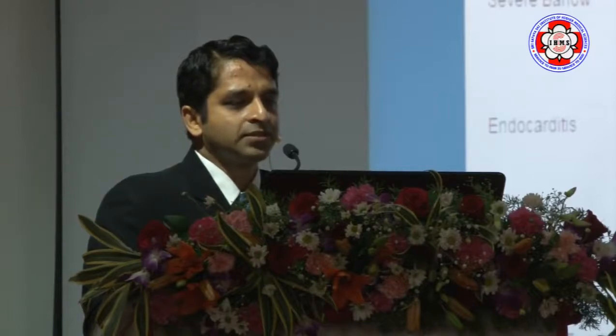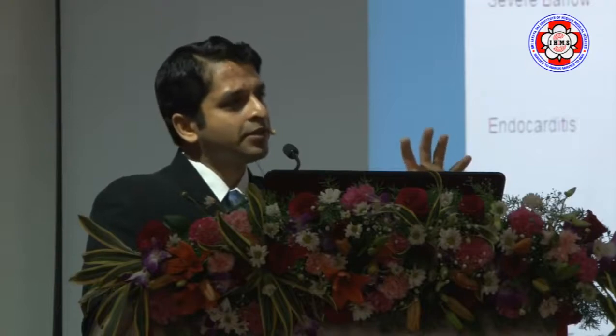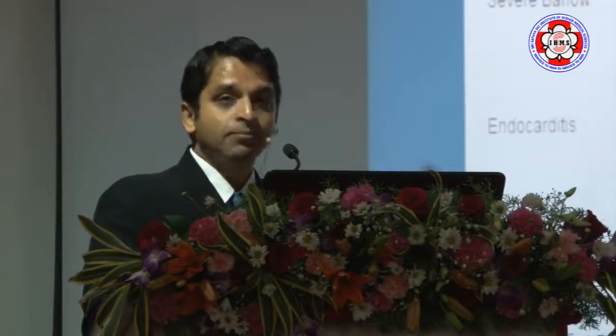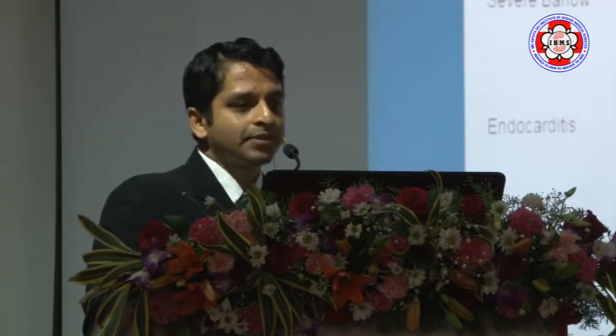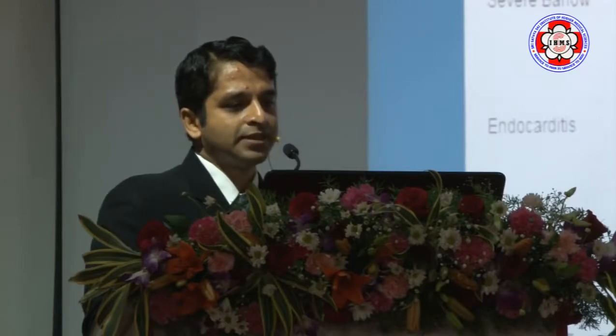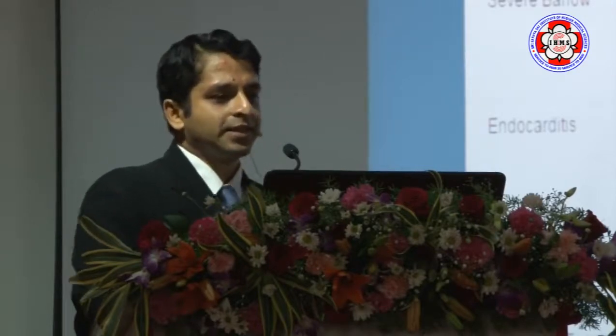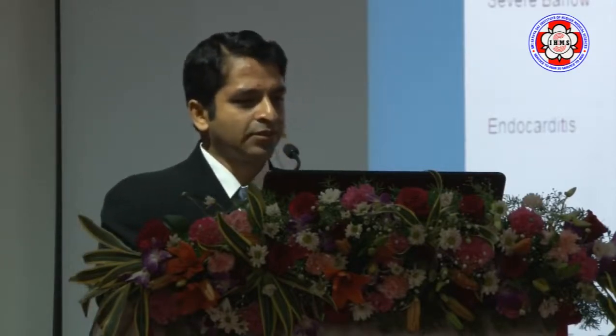the Carpentier classification. Barlow's, especially when you have 3 or more scallops involved, and this is where the echo, I think, really plays a big role: how many scallops are involved, what particular parts of the scallops are involved. Especially with moderate annular dilatation, it gets more difficult. Same thing with rheumatic, and as the Barlow's extends, again, it becomes more difficult. As the leaflets get destroyed by various other diseases like endocarditis and so on, then it becomes more difficult.